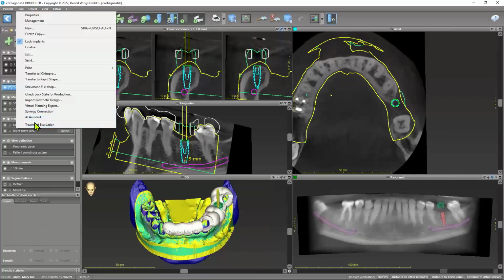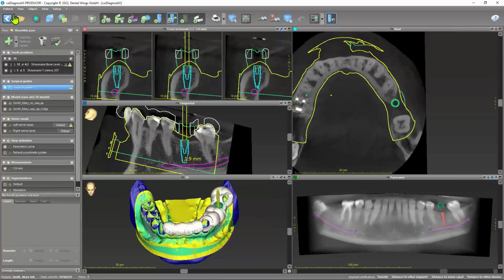And the others here are getting new. We have the AI coming within the next year all over the world. At the moment, we are just starting in Europe, so I will not explain it today. And the treatment evaluation, nothing for today. This is something for universities, not here.